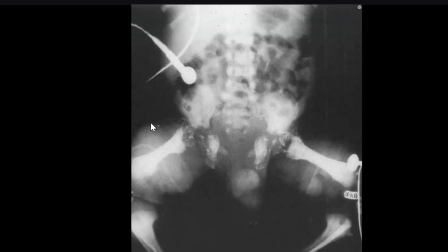There is a widening of the pubic symphysis in the midline. Both proximal and distal long bones are short, and there is a slight widening of the metadiaphyseal ends as well. Proximal and distal metaphyses are flared. The soft tissues appear normal. The evaluable sacrum appears normal.